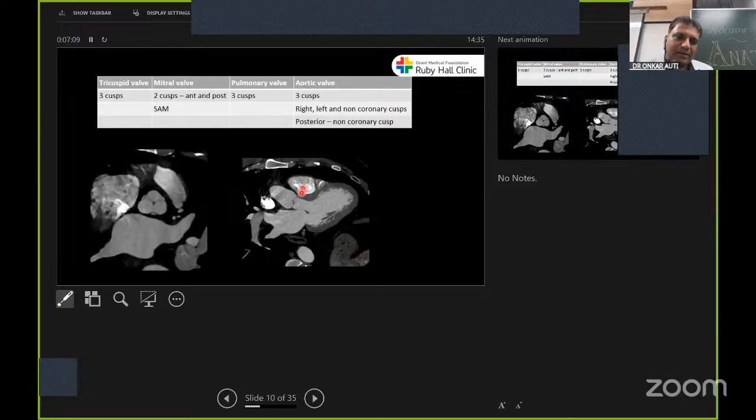Okay, so if you cut across this aortic valve over here, you are seeing something like a Mercedes sign. Can you see that? Okay, so these are the 3 cusps of the aortic valve. That also you can see in much more detail. The posterior-most cusp is adjacent to the atria, okay, the left atrium and the right atrium.